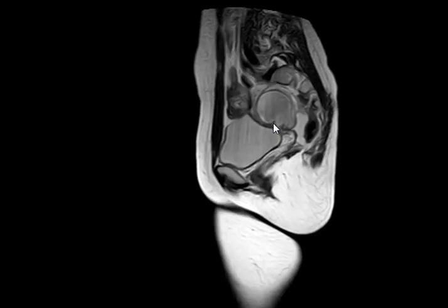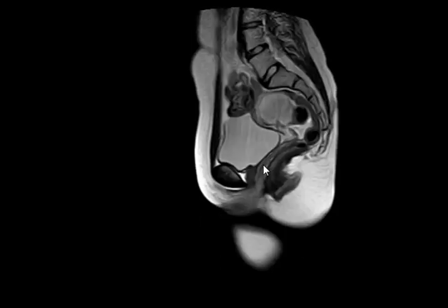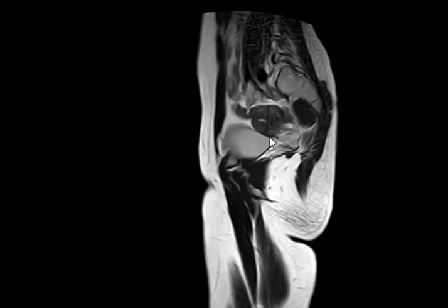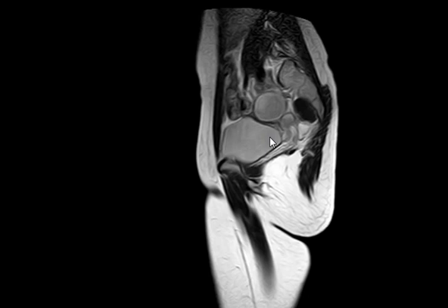First of all, MRI, sagittal view, T2 weighted images of a young female patient. Don't judge just by looking at one sequence. You have a lot of sequences. See more than one to avoid any surprises.